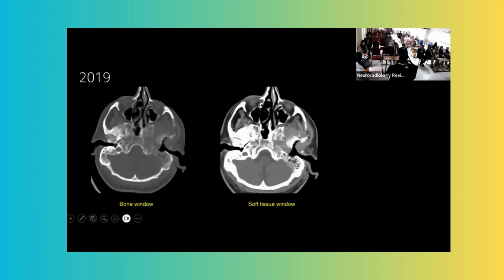There are no ossicles here, and there is a diffuse disease process involving the entire skull base in the masticator space, involving the bones, internal ear, middle ear, petrous apex, all the way going to the foramen rotundum here. So it's a diffuse process going on, and it's causing erosion of the bones, and it's not respecting the boundaries of the anatomy. So it is basically an infection of the skull base called malignant otitis externa.